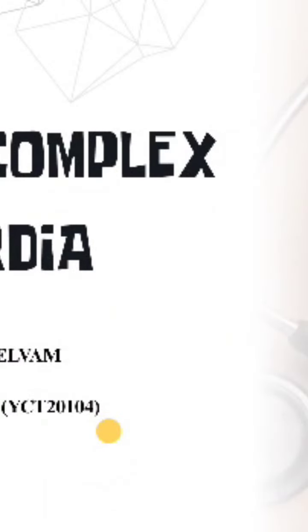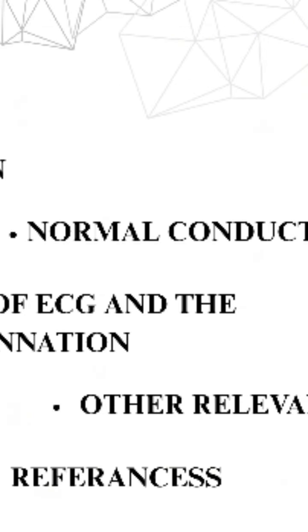Today I'm going to talk about narrow complex tachycardia. In today's topic, I'm going to talk about the introduction of narrow complex tachycardia, the normal conduction system of ECG, three examples of ECG and the explanation, together with other relevant information on narrow complex tachycardia.